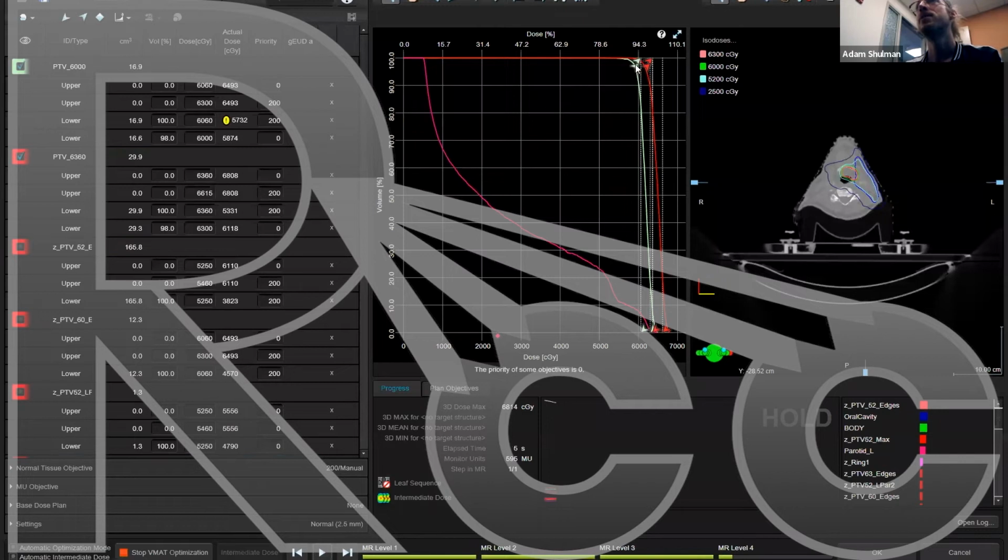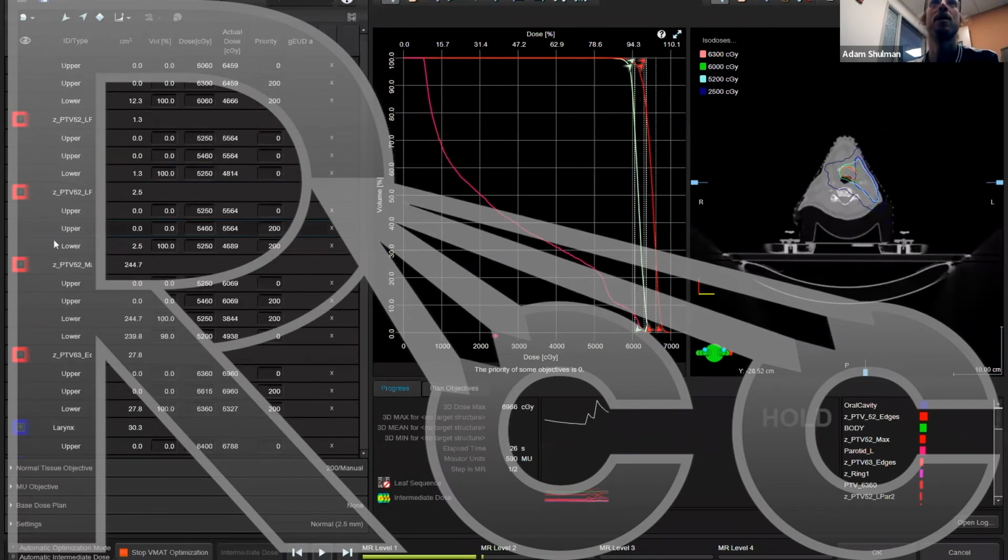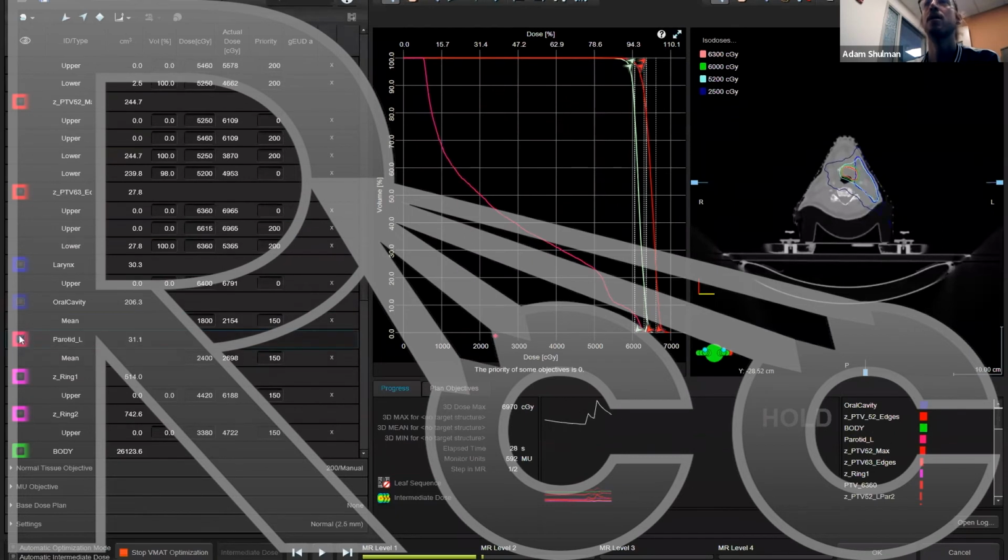Okay, so it's already been optimized. Remember, we're not going to do gross adjustments. We want to optimize our parotid, for example. So we're not going to do it in step 3 or step 4. We'll go back again, and we can start optimizing in step 2, for example. So let's put on my parotid. Here it is. We got a mean dose of 27 in this case. And I'll show you this first, then I'll show you something else.